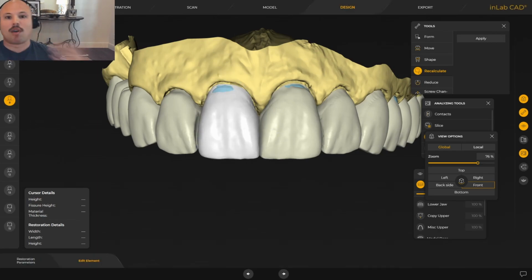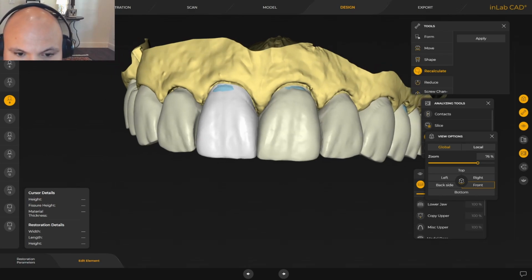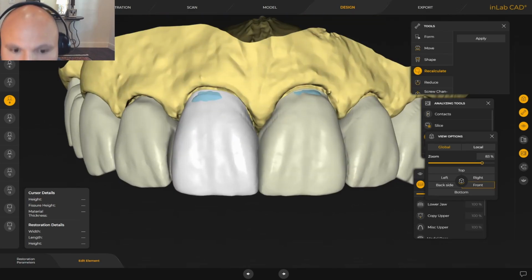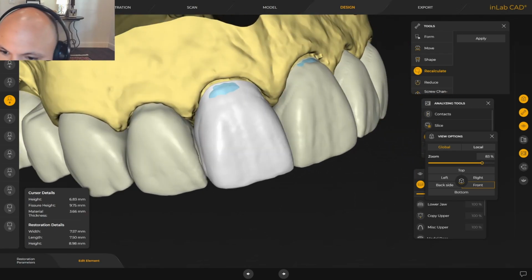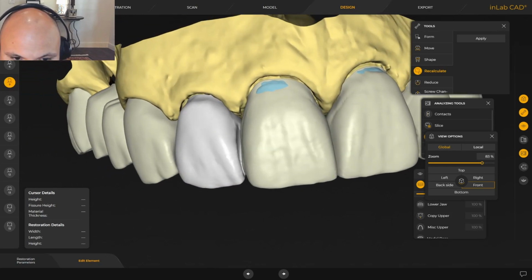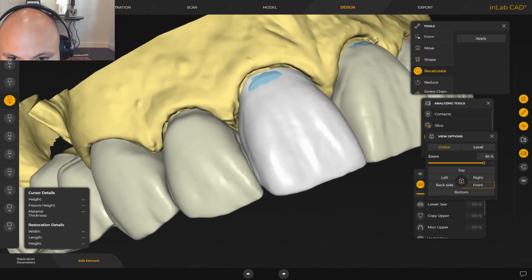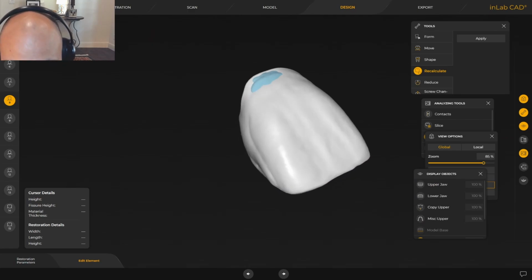And as you can see, we've already got a better result. Of course, this could be a little better, but that's how I handle these kind of situations when I'm biocopying. Same thing here, we have a concavity, and I find it easier to smooth out the convexity than fill in the concavity. We know that midline's good, so we can move on.